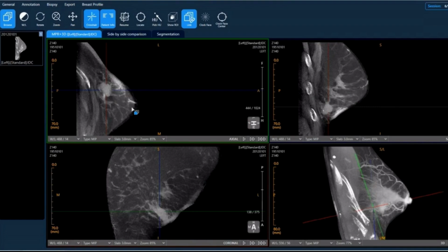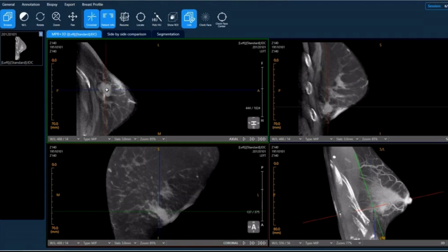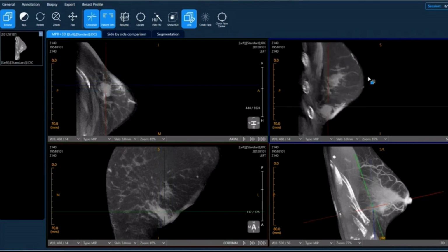The Koning breast CT eliminates the tissue overlap by a 360-degree scan of the breast in 7 seconds, and also by displaying any location in the image from all directions. So there is no lesion to hide behind any of the tissue.